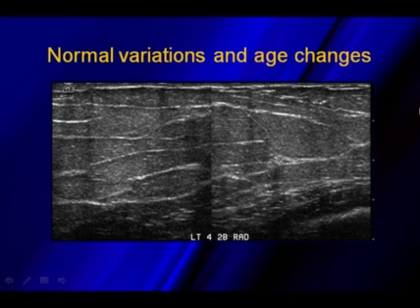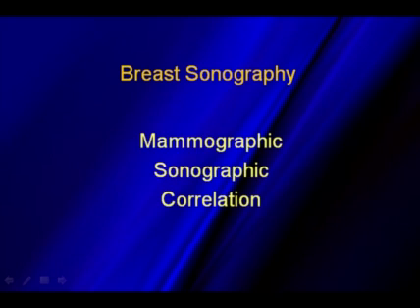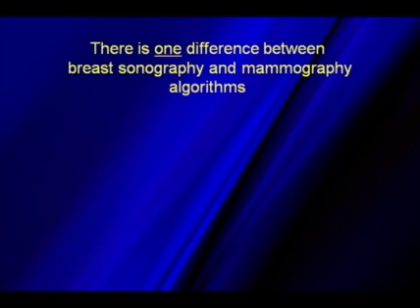all the way into a completely fatty involuted breast, where here we have the skin, here's kind of the pre-mammary fascial layer, and the entire mammary zone is filled in with fat that we really don't see any fibroglandular tissue in this completely fatty involuted breast. So just sort of normal variations that we see with age change or hormonal changes, from a normal breast to where there's a little bit of fatty infiltration into more, and all the way into complete fatty involution of the breast.